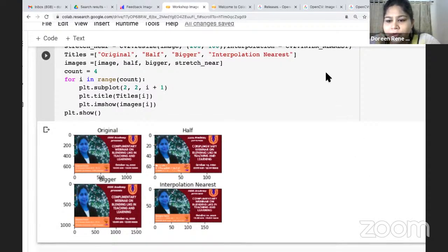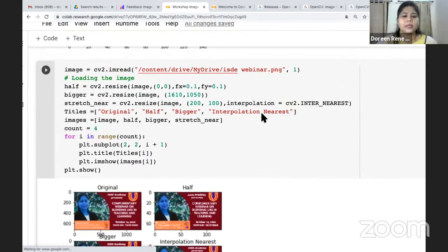Yes, I will show it. We are going to work on with that. Once we completed the basics, then we'll be taking an image of a cancer image using MRI. See, these are the basic things that you need to work on. Once you're strong in your basics, any data set that you're given, you'll be able to work on with that. You can take any data set that you need to use.